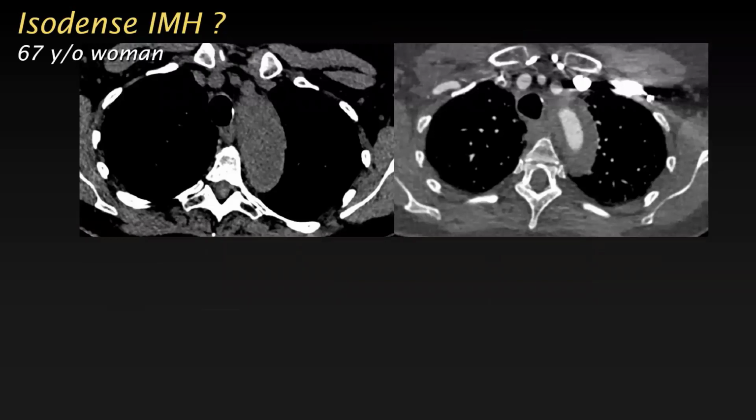Now, here's a couple of other challenging questions to clarify some of the issues. So this patient is a 67-year-old woman with an intramural hematoma, and you can see on the post-contrast scan, at least it does look like IMH. You see the contrast here. This is proximal descending aorta. Again, this is not arch, this is descending aorta because arch vessels are here. So we are just in this arching area of the descending thoracic aorta.